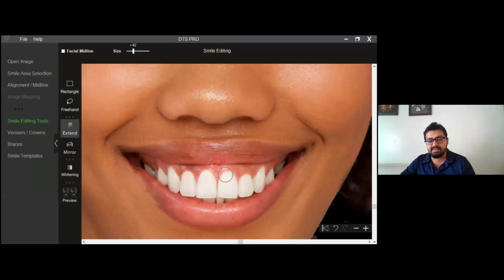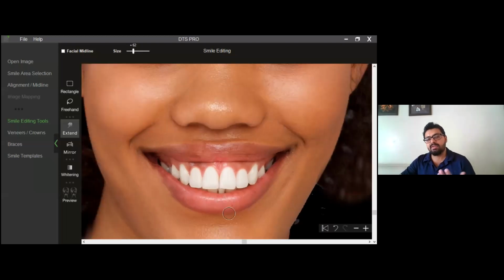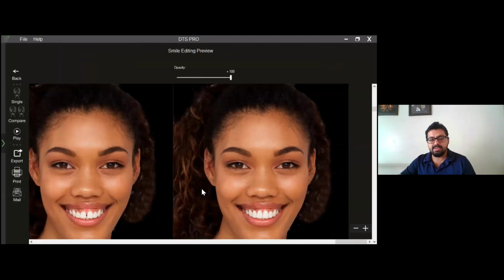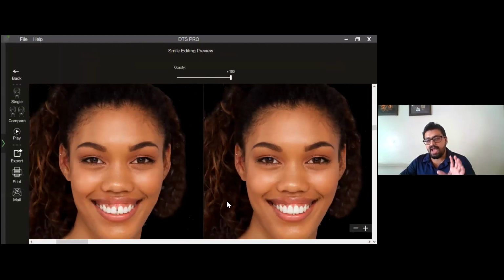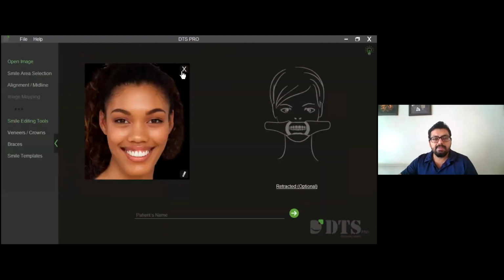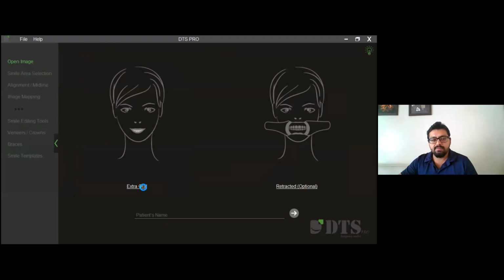So the awareness itself happens in the first visit. As they say, begin with the end in mind. These tools really go a long way in helping us achieve that, right? So something which has helped us simulate the diastema closure with orthodontics, also some amount of crown lengthening. Of course, I have done a little bit of aggressive crown lengthening there, which might not necessarily be done in the clinical situation, but just to give you an idea of what exactly I am trying to project here, right? Okay, now let me upload another image of a patient with crowding.